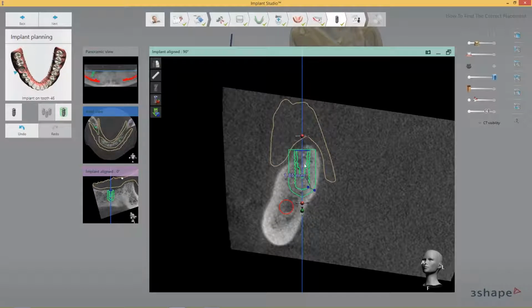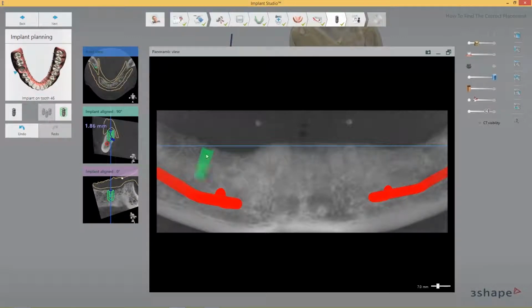Also, now where we have positioned the implant in one direction, we can also see it in the other directions. We have the panoramic again, how it's positioned. And as we talked about in the last webinar, we are following the straight line. So even if the pano is curved, we see this as the straight plane, and we place the head of the implant at the same level.